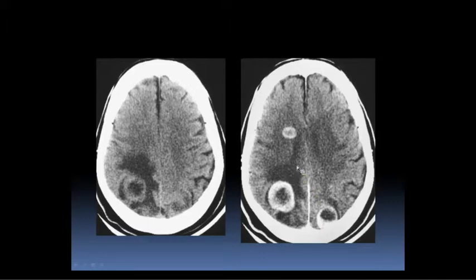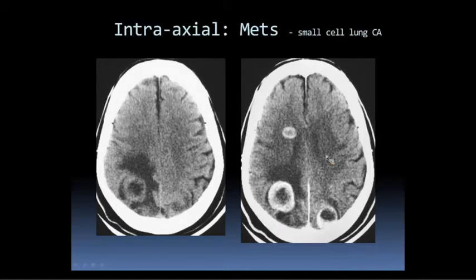Multifocal abscesses can happen, but this one is almost solid in appearance, and some of these have a very thick nodular wall, and this was metastatic disease. However, abscesses would still be in the differential. When you have multiple ring-enhancing lesions, your top two things by far are metastatic disease and abscess. And of course, the clinical picture many times helps us suspect abscess.